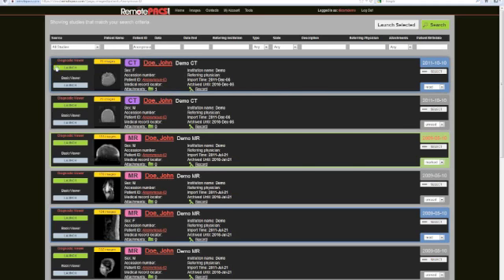Over here, we give you, on the left, two different types of viewers. The diagnostic viewer, which is an FDA-approved viewer, and it will open in Mac or Windows. Just requires Java, which most PCs already have installed on it anyway. So there is no installation process to pull it up. It comes up if you have Java already installed.